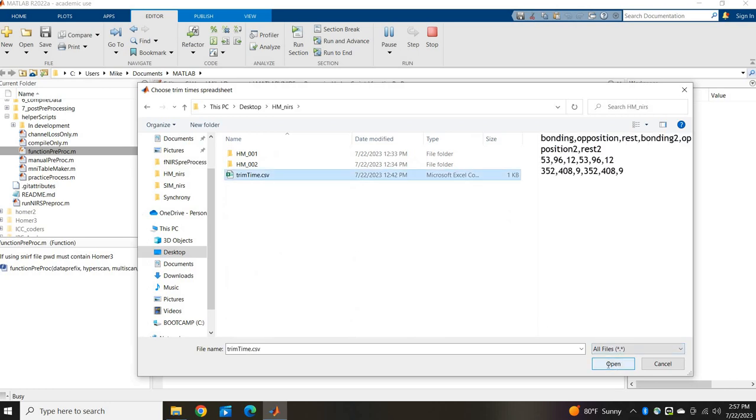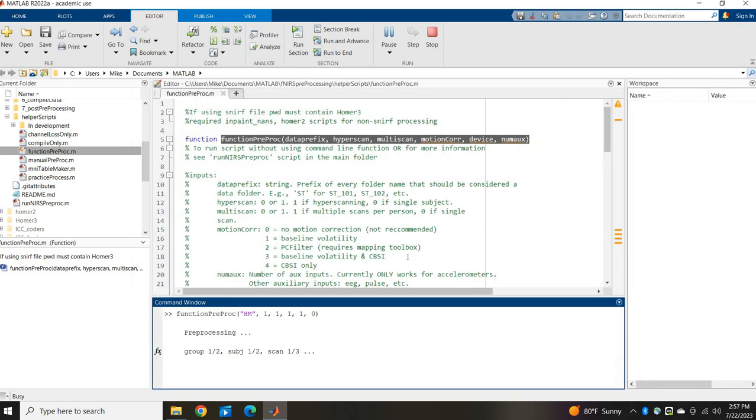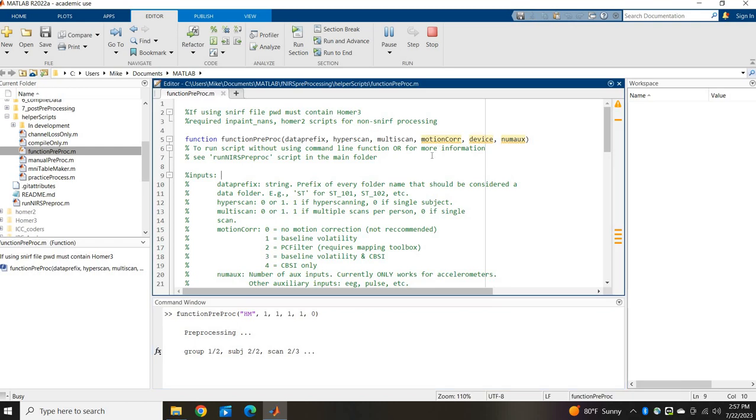And I'm going through this pretty quickly because I actually did go over this with the runNIRSPreproc video. So sorry if this is a bit quick. If you want a little bit more information about some of the things I'm selecting, you can go to that video and check it out. Or you can read all the notes on my GitHub, or all the notes on each one of these scripts. It's up to you on how you want to better understand some of these things.